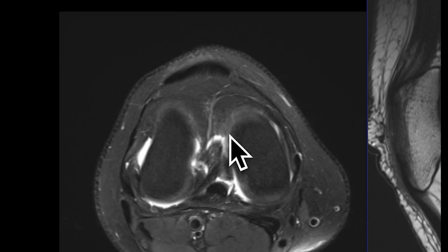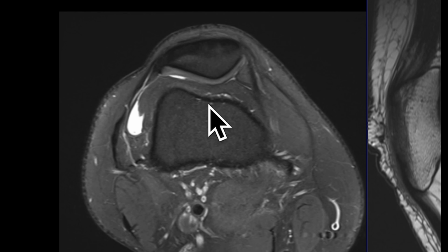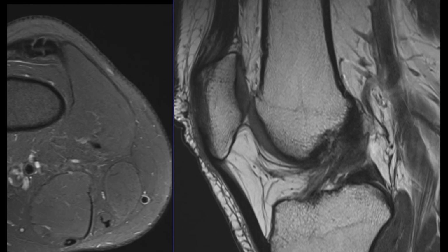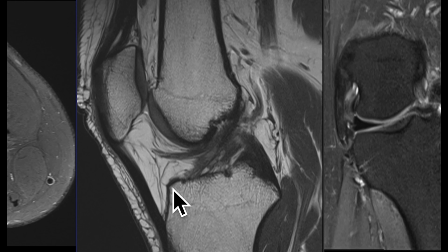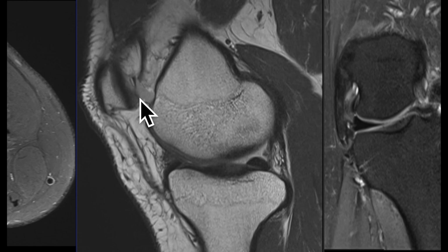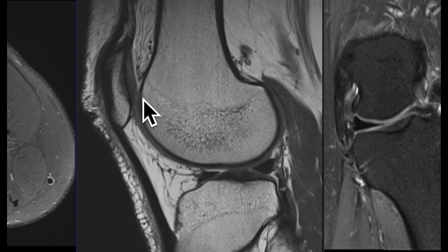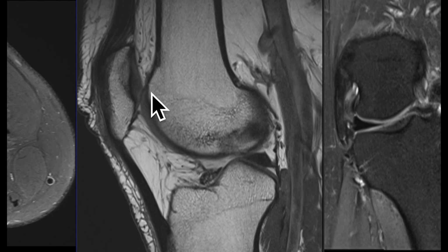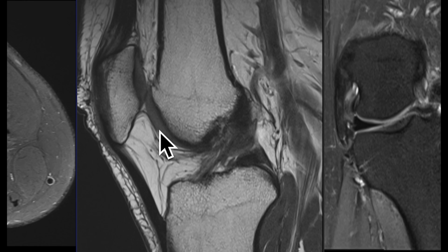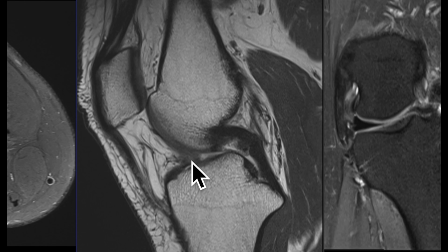So we can see that all the way. We're going to scroll all through the images and assess the patellofemoral cartilage in its entirety from cranial to distal. I like the sagittal images for looking at cartilage because not only can you see the patella cartilage here, and you can scroll all the way from medial to lateral, but you can also see the femoral trochlear cartilage here. So this is the lateral femoral trochlea here. We'll go into the trochlear groove, through the groove, and then into the medial femoral trochlear cartilage.